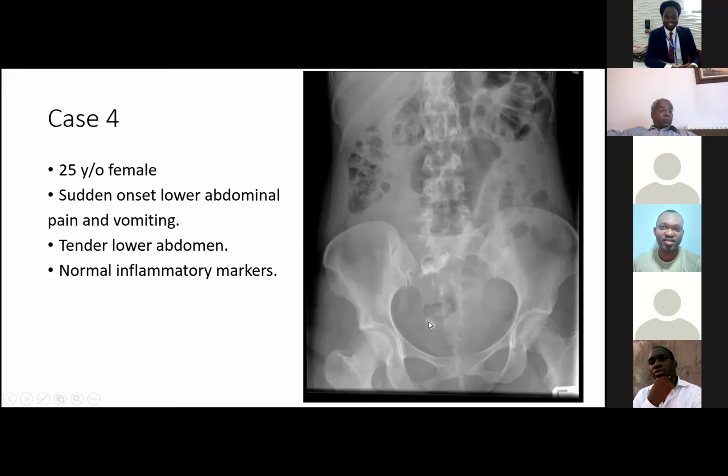Yes, I mean, it's not quite corresponding. I know the first case we saw was appendicitis, which was down in the right hemipelvis, almost this kind of area. Typically with appendicitis, you tend to get them in this kind of area here, but there is this opacity here. There's another clump of opacities as well over this area here.